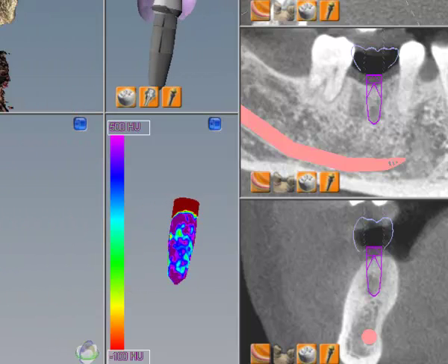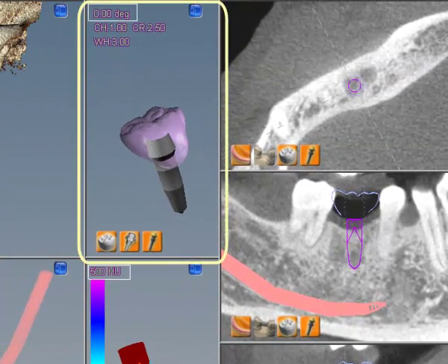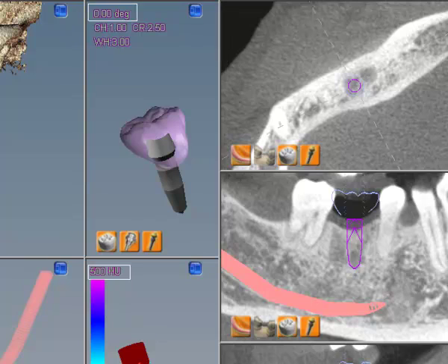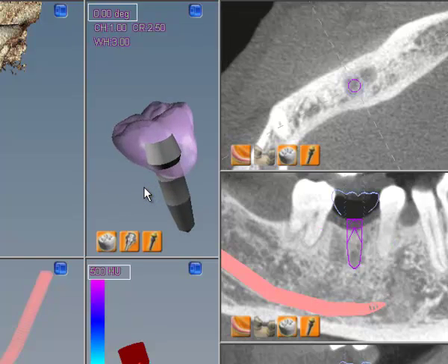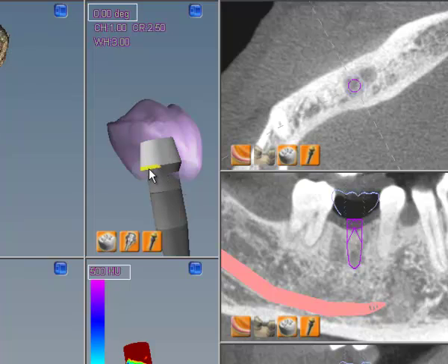The abutment view displays the position of the implant in relation to the E4D proposal. The abutment analog is a representation of a standard abutment with adjustable parameters of collar height, collar radius, and axial wall height. Left-click and drag on one of the adjustable areas of the abutment to change the shape. The measurement of each part of the abutment is displayed in millimeters in the top left corner.